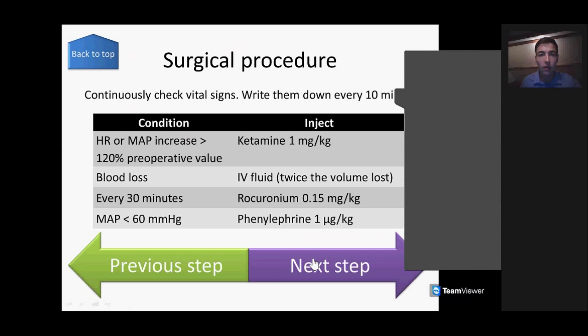If we go back to the port, so now it's going to be the time of the surgical procedure. So there's other stuff you can inject to the patient. I'm not sure it's going to be necessary. Probably not, because there's no link between the mannequin, the surgical field, and the software. But if for example you want to simulate another additional blood loss, that's always possible.